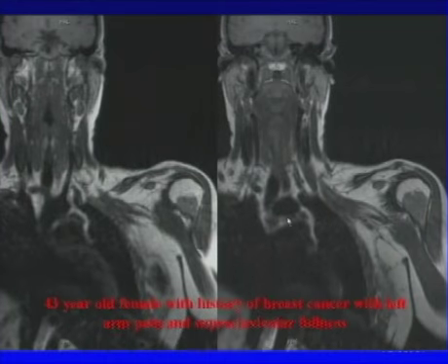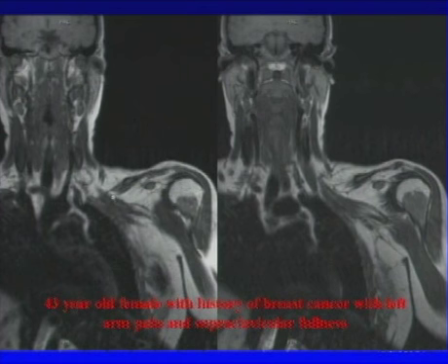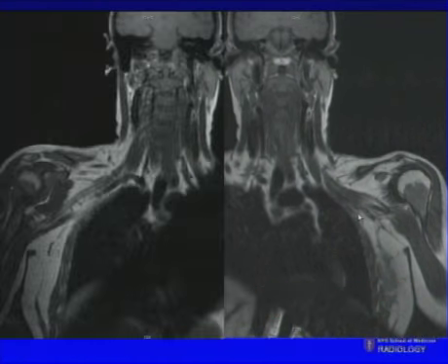So we look at the coronal T1 weighted images, and if I follow it out from the scalene triangle out to the axilla, I can see that there's diffuse soft tissue within the supraclavicular, retroclavicular, and axillary component. Okay, so easy enough. And here's the contralateral side to show you the difference within the left brachial plexus as compared to the right. Again, I can make out the fibers of the brachial plexus, whereas on the contralateral side, this is diffusely thickened.